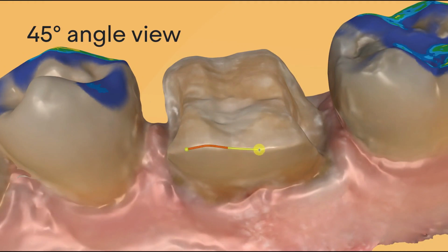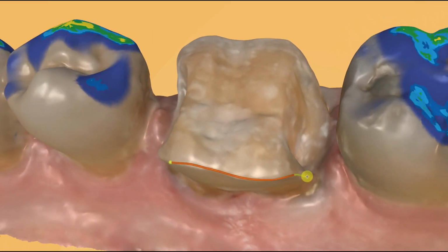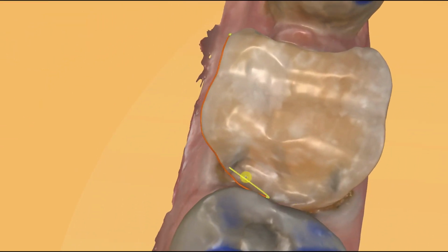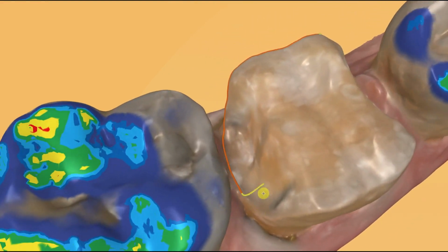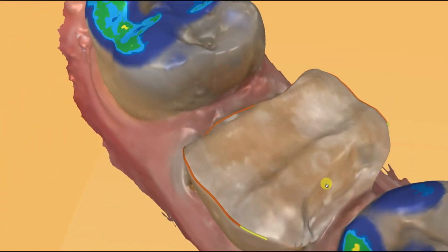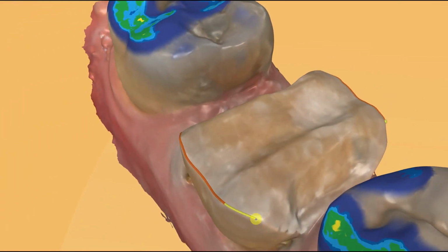Now we're looking at drawing the margin from an angle. So rotating the model, let's say 45 degrees to the viewer's angle, and then from this perspective drawing the margin and going step by step. So literally trying to place the margin perfectly as we go around. The idea here is to do this once and not draw the margin multiple times, but just go through and lock it down exactly where we believe.